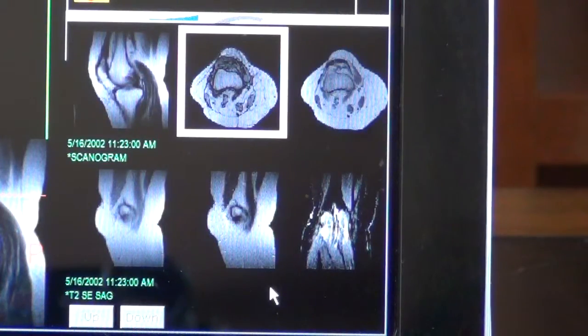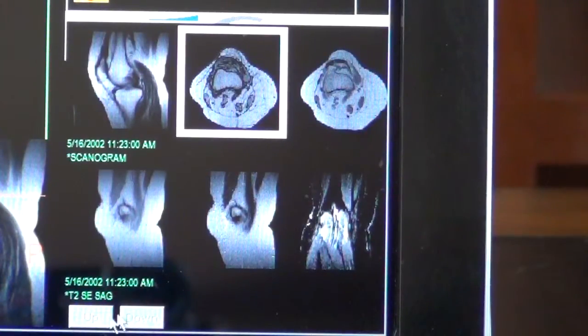In the lower right hand corner of the screen we have the thumbnail images. This represents the images that are available for viewing. Each one will have a time and date stamp and, if entered, a study description. This area could be completely filled because we can also prefetch automatically any priors and have them available as thumbnails as well. So if you fill up this area with thumbnails, these highlighted buttons will also appear, allowing you to move down through the selected images and bring those images into view or on the screen for comparison work.